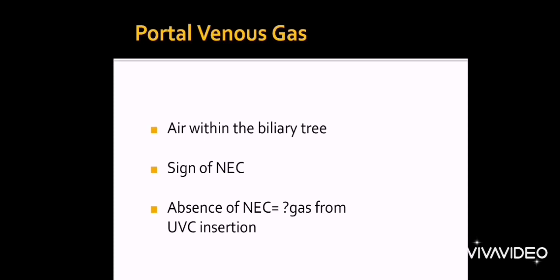Lovely. So portal venous gas. This is when there is air within the biliary tree. So it can be a sign of NEC. However, in the absence of NEC, so obviously looking at the whole clinical picture of the baby, it could be gas from a UVC insertion.